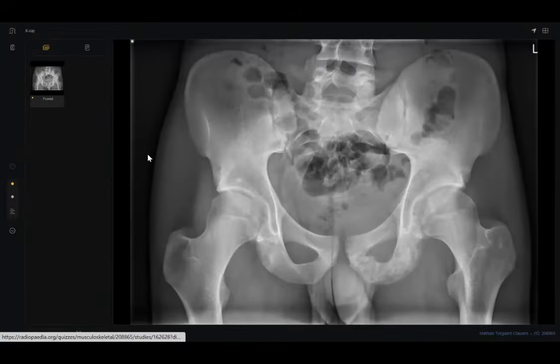Take some home messages. Your role in the exam is first of all to tell the examiner whether this is aggressive or not. Next, you neglected this soft tissue. How could we know this soft tissue? Look at these gases. See why the gas came here and shifted, elevated. At least there is soft tissue here. Look here at this fat plane.